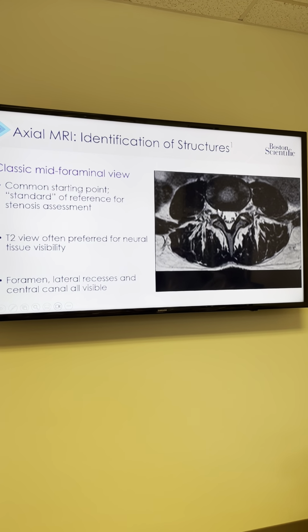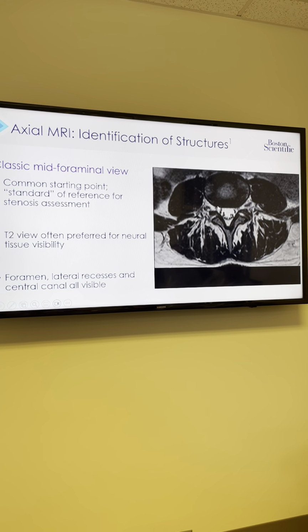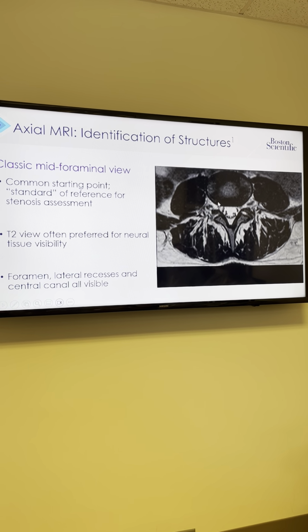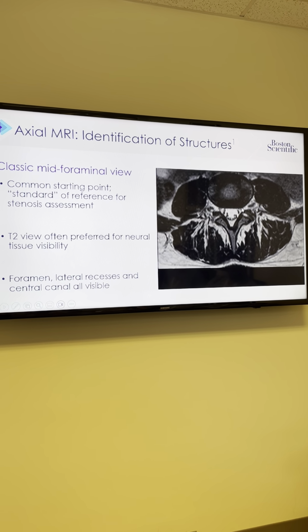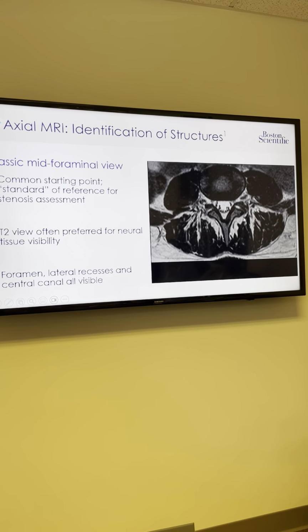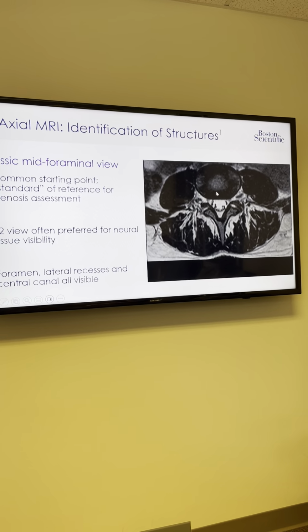You see it looks like a kidney bean. It's kind of got its concavity. As discs degenerate, they may get a disc protrusion and become a little more flat, and that would then cause maybe mild stenosis, which we'll talk more about. So we assess the disc.